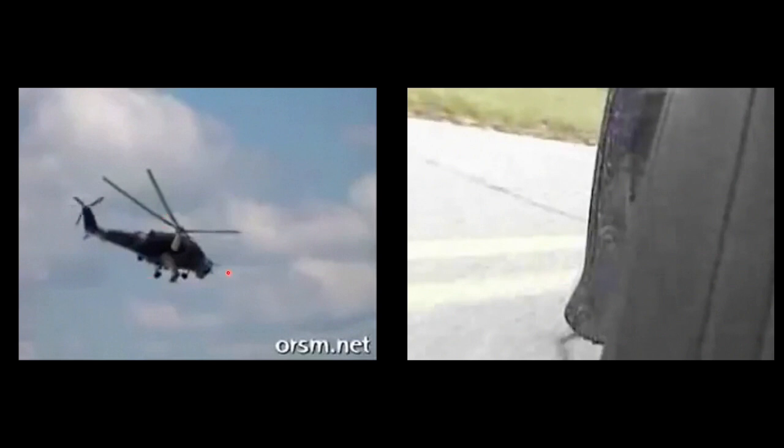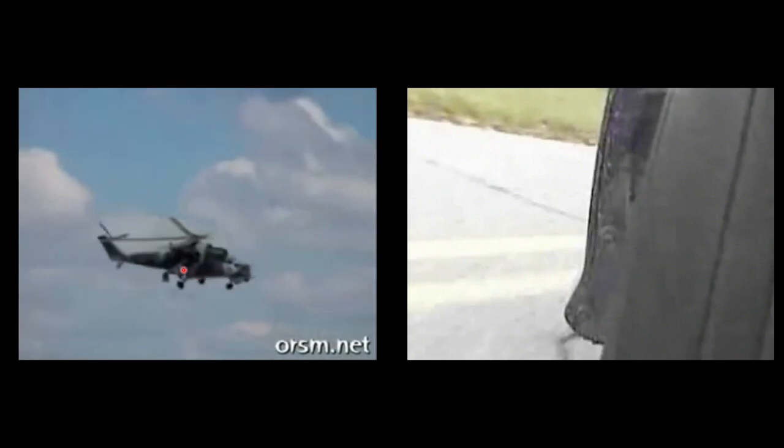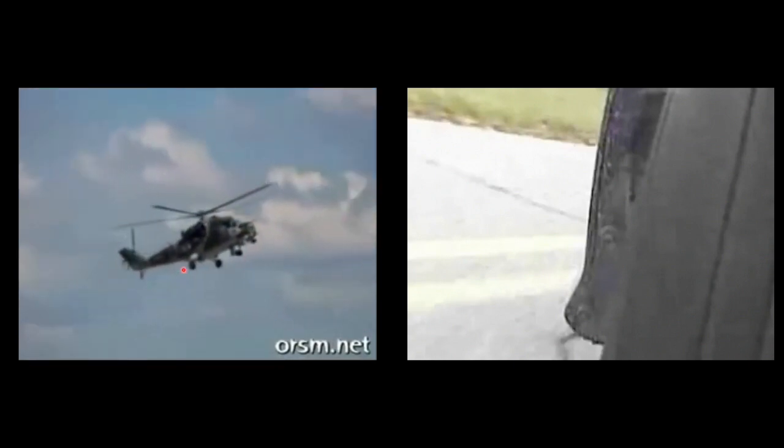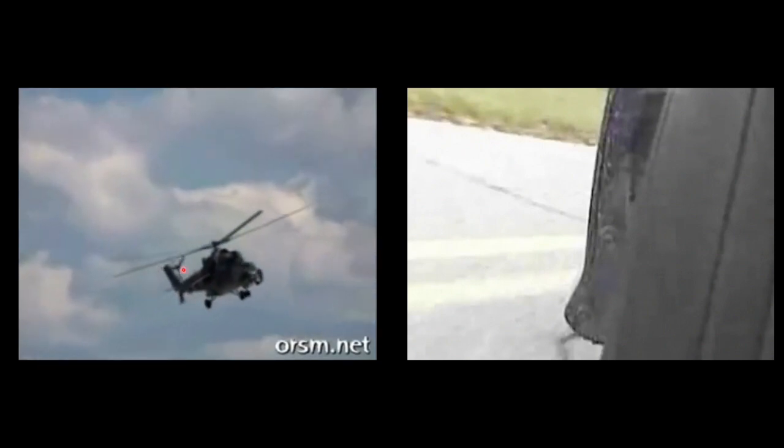Here's one where the helicopter looks like the blades aren't moving, but all that's happening is that when the camera is taking those individual images, the frequency at which it takes them is the same frequency at which the blades are moving around, so it's not able to depict the actual direction of flow. Here's an example where we're looking at a wheel, and we see that the wheel is going in one direction, then it slows down and goes in the reverse direction, then slows down and goes in the forward direction.